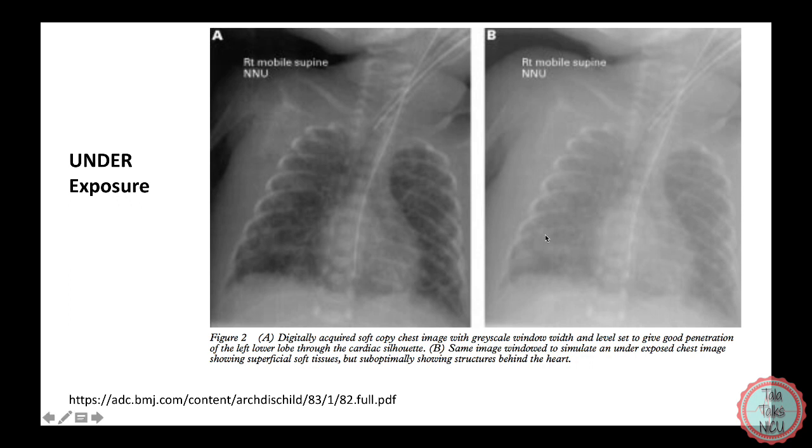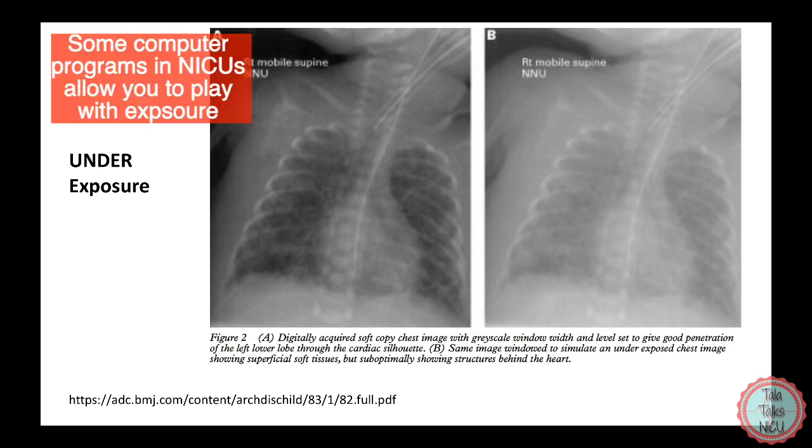Obviously, the exposure of the X-ray completely depends on the radiology technician, so there isn't really a lot that you can do about this, but if you do notice that the X-ray is very hard to read because of the exposure, then it does need to be done again.